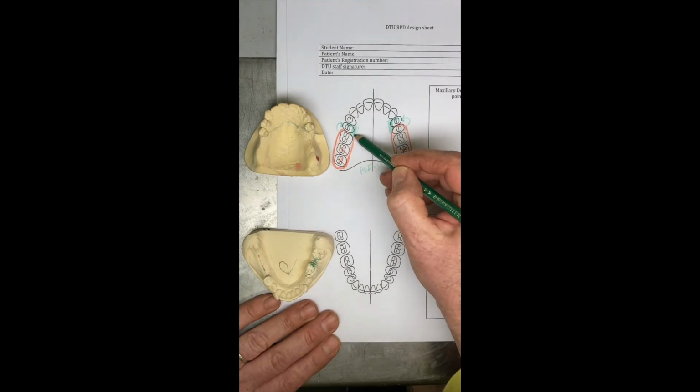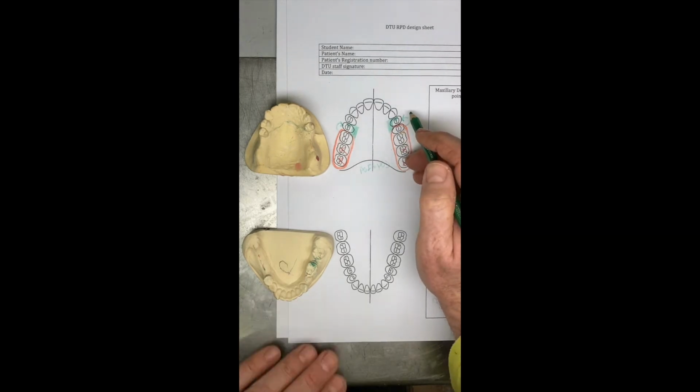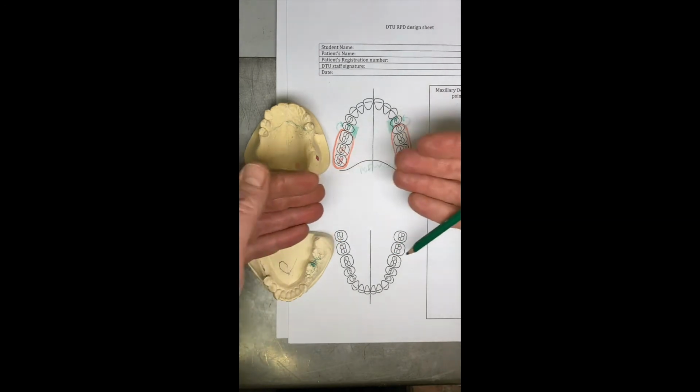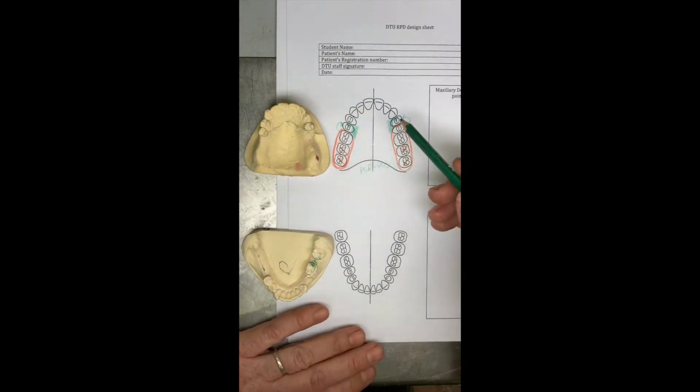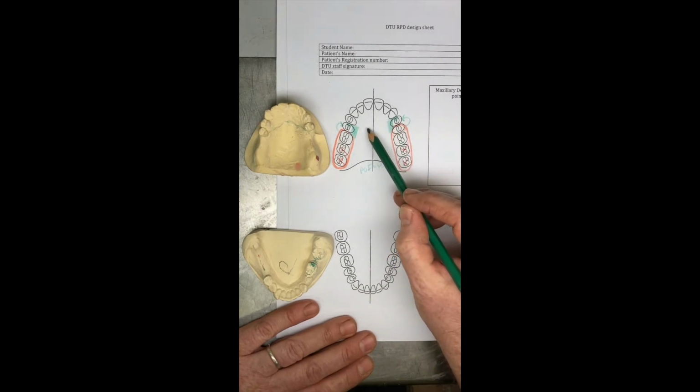But for now, let's consider putting reciprocating plates on. Nice for the patient's tongue, simple to use. And then once we've got our reciprocation on, we need to think about bracing. So this is this sideways movement of the denture. And I said that typically it looks after itself, particularly when we've got a lot of components on the teeth.